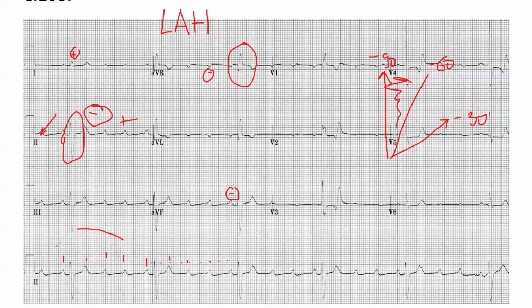Very good. And the ratio is? The ratio is more than 2 to 1. This first one is conducted. The next one isn't conducted. The next one isn't conducted, and then the next one is conducted. So we have 4 Ps, and out of the 4, only one is conducted. So 4 to 1. Exactly. Good.